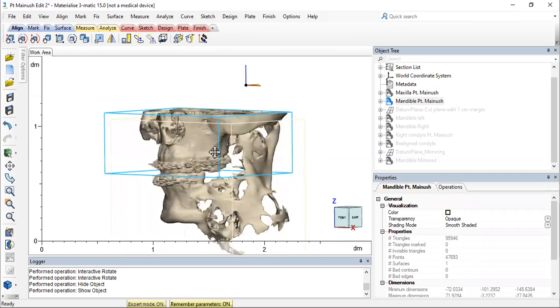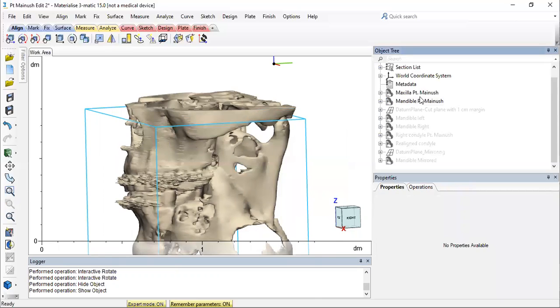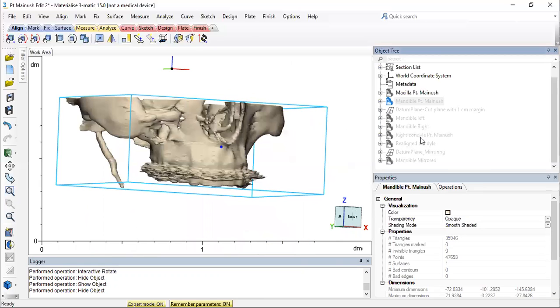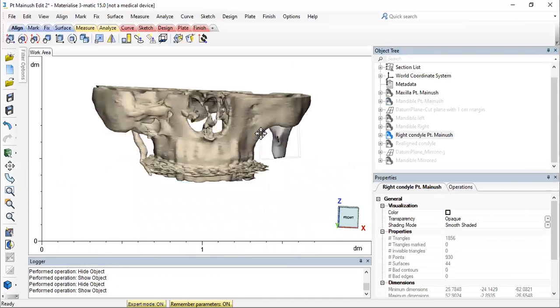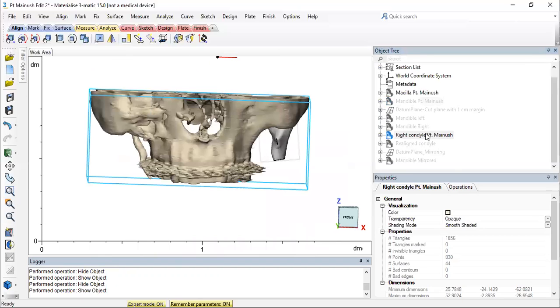But just in case the mandible tumor has destroyed the condyle, or there has been a fracture, meaning it is very brittle, or there is bone loss in the condyle as well, in those cases what we do is we first draw the healthy anatomy. I did not preserve the original, so I'll just repeat the steps.